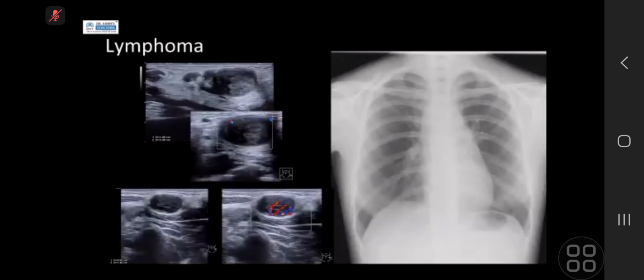Another thing that we tend to look for: in kids, especially with lumps and bumps, we always get them to have an ultrasound. A lot of people say you can suspect lymphoma with ultrasound, by how the nodes look. Unfortunately, this is true for adults, but in children it is less likely to be so, because lymphadenitis or reactive lymph nodes, due to whatever reasons, can look very similar. Some people say peripheral vascularity makes it more suspicious, but I think that's difficult, because this case is lymphoma.